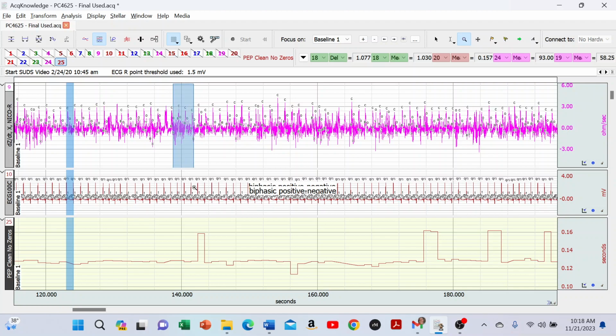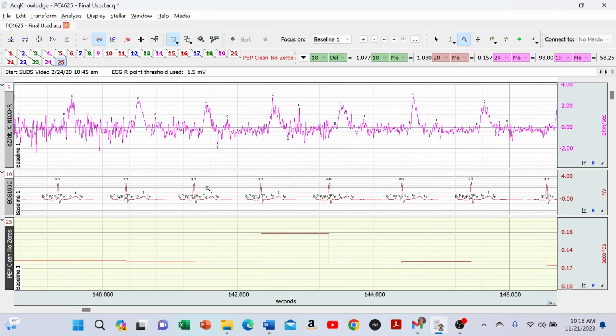So I'm going to zoom in right in this area here, and you see this is a very noisy aspect of the data. I had cleaned this before. Whenever I saw a very noisy B that was a little questionable as to its placement, I would clean that out and interpolate between one cleaner one and another cleaner one.